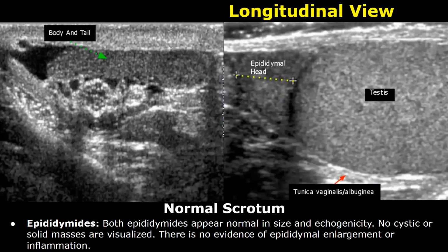Then you can write the appearances of the epididymides. Both appear normal in size and echogenicity. No cystic or solid masses are visualized. There is no evidence of epididymal enlargement or inflammation.